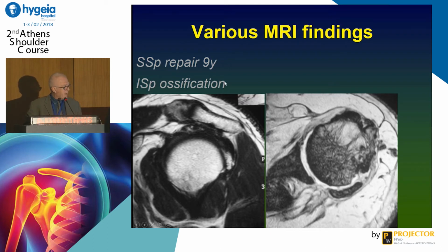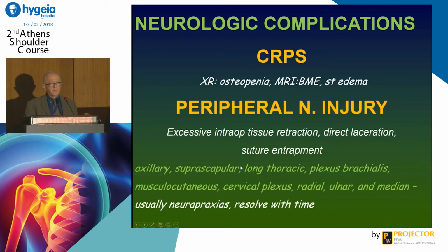Sometimes we deal with unexpected findings. 9 years after supraspinatus repair, we see that there is ossification of the infraspinatus muscle.